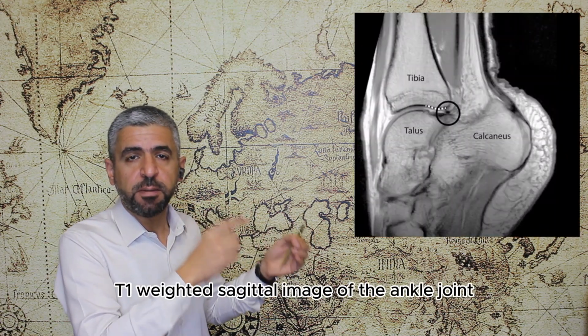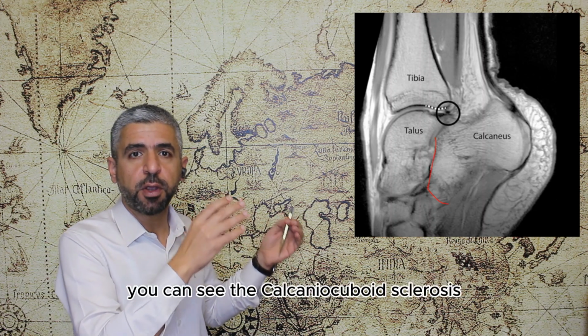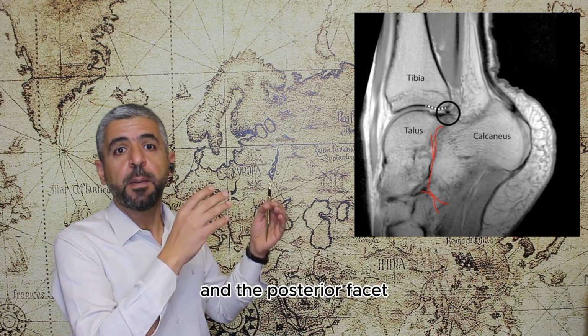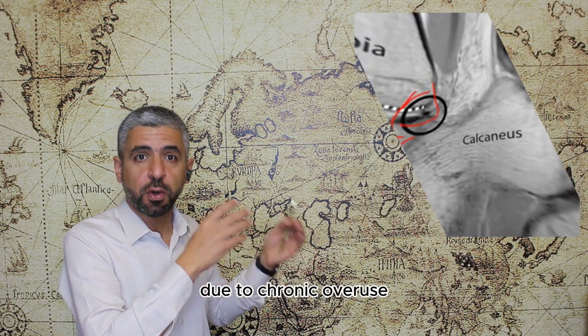In this T1 weighted sagittal image of the ankle joint in the dancer's foot, you can see the calcaneocuboid sclerosis, and the posterior facet is showing some kind of sclerosis due to chronic overuse.